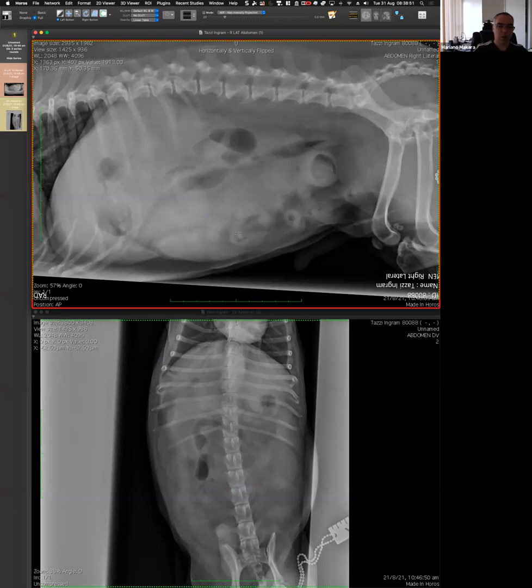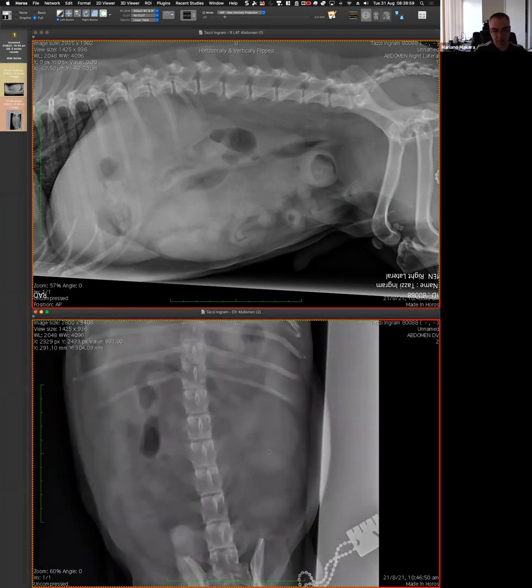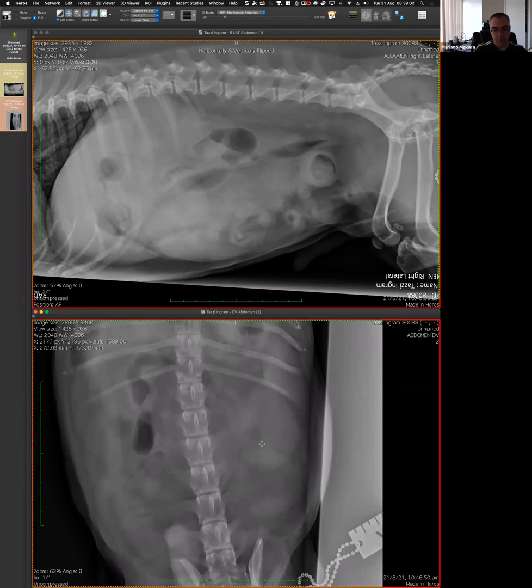It makes sense. So this line that we see here is very likely not within that tubular structure. It is something that is superimposed, like a bowel loop, similar to the case here. This is a bowel loop that we don't know where it goes, maybe that way, and maybe here this way. And then we are making up maybe something in the middle, so it looks like a mass.